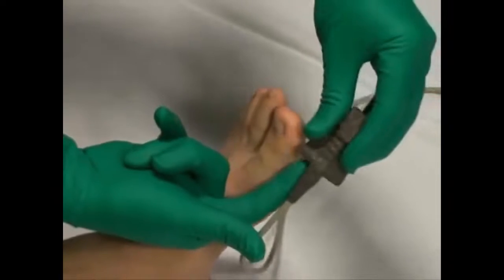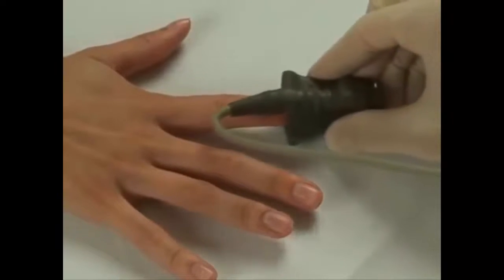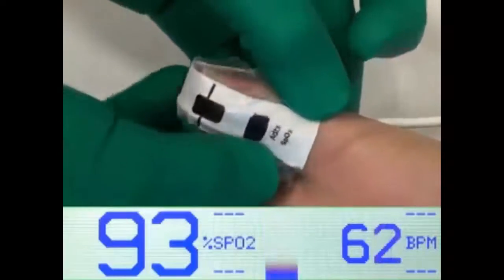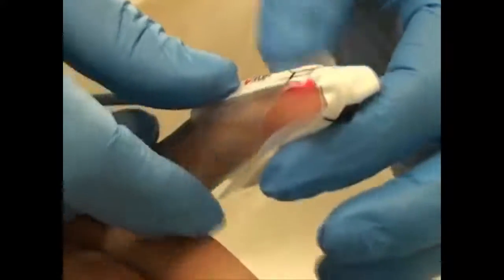If the probe is not the right size, the light-emitting diodes may not line up correctly with the photodetector and will provide inaccurate data. For example, a probe that is too large for a patient's finger may slip, and the light may not pass completely across the finger. Venous pulsations may occur if a probe is too small or is placed too tightly on the finger. These venous pulsations will produce interference, resulting in a falsely low pulse oximeter reading. Pulse oximeter probes with adhesive sensors may minimize motion and may yield more accurate results than non-adhesive sensors.